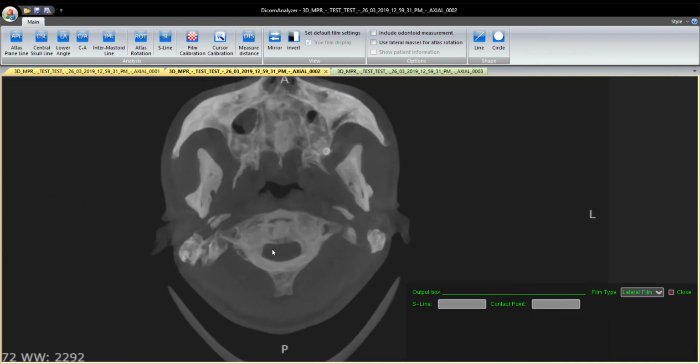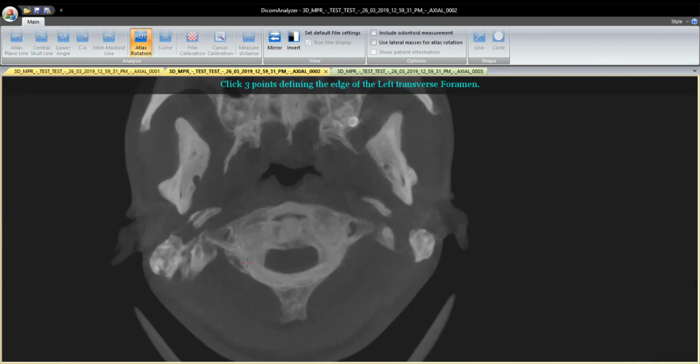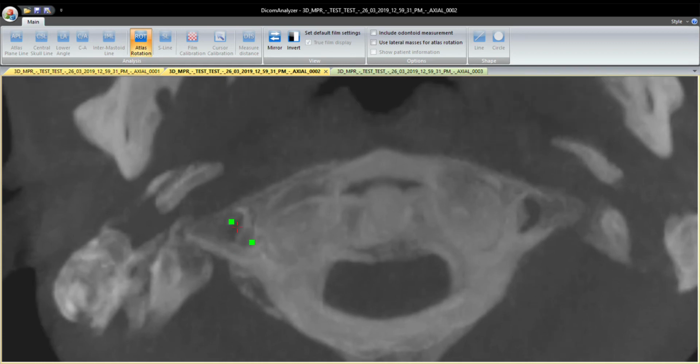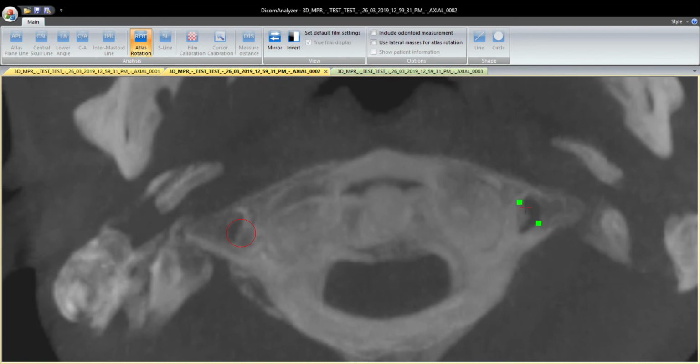We get into more interesting territories if we're looking at the vertex. We can hit our rotational component, zoom in here and get to where we're marking the circle there. These unfortunately are fairly low resolution. There may be a way to increase the resolution that we're getting off of them, but for what we need right now, it's good enough to be able to see the points.